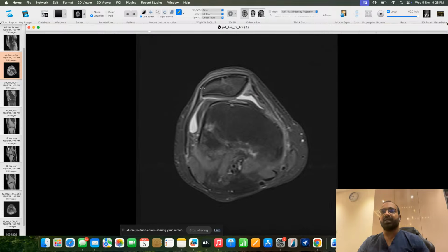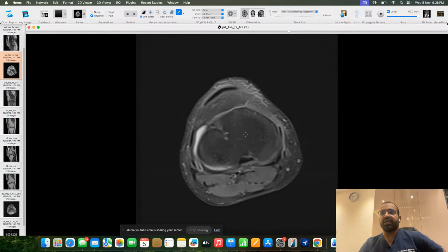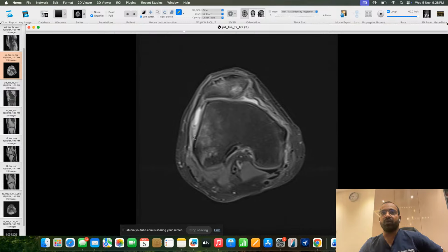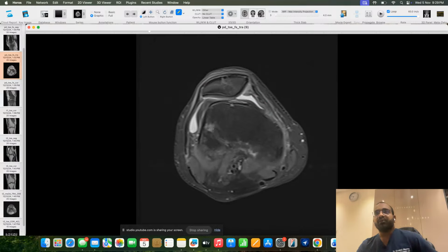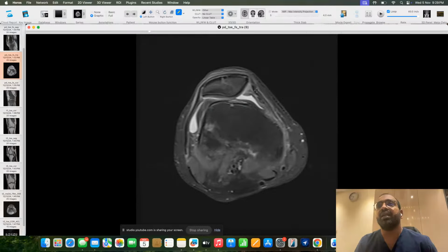So there is lateral patellar dislocation, because of which there is a pull avulsion of the medial patellofemoral ligament. And also, as it is going laterally, this surface of the patella, that is the medial facet and midpole, gets rubbed against this lateral femoral condyle, causing this bone bruise. So this is a case of lateral transient patellar dislocation with high-grade tear of medial patellofemoral ligament.